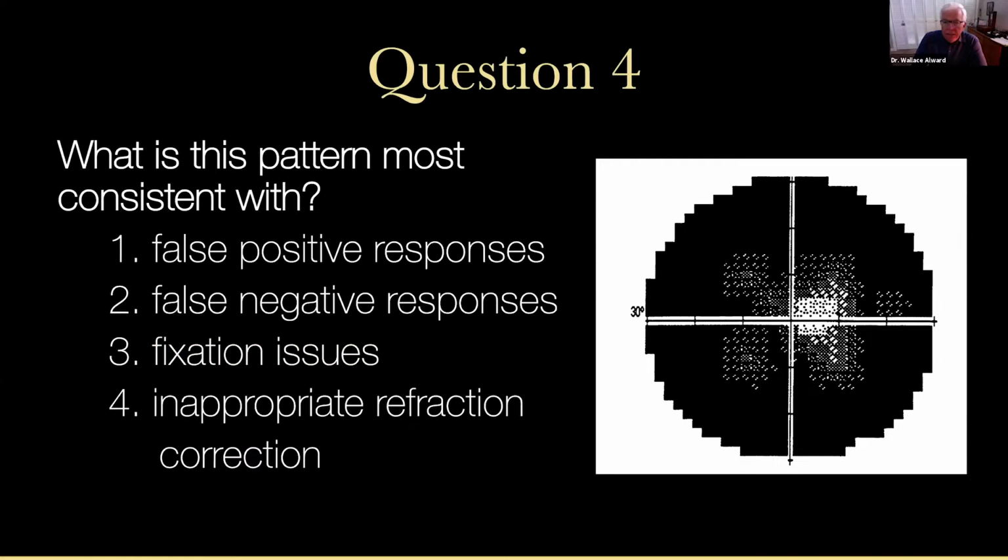And lastly, this pattern, what is that most consistent with? Same choices again: false positive, false negative, fixation issues, inappropriate refraction. Great. So again, the vast majority of you got this right. False negative responses is a classic cloverleaf field.